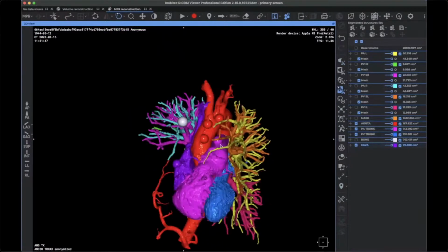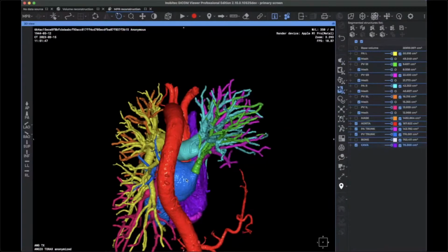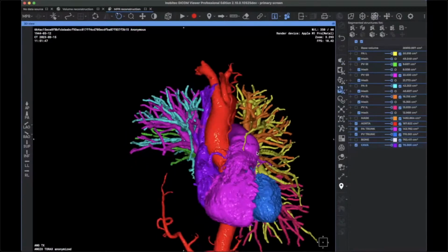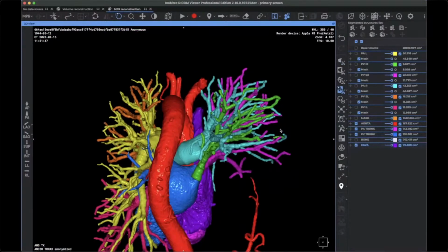And now it's done. Aorta, pulmonary artery, all the left and right pulmonary trunks, main pulmonary vein, left, right, superior, inferior pulmonary vein, all of them individually isolated very fast. Took around 10 to 12 minutes to complete the whole process. Very fast. That looks amazing.